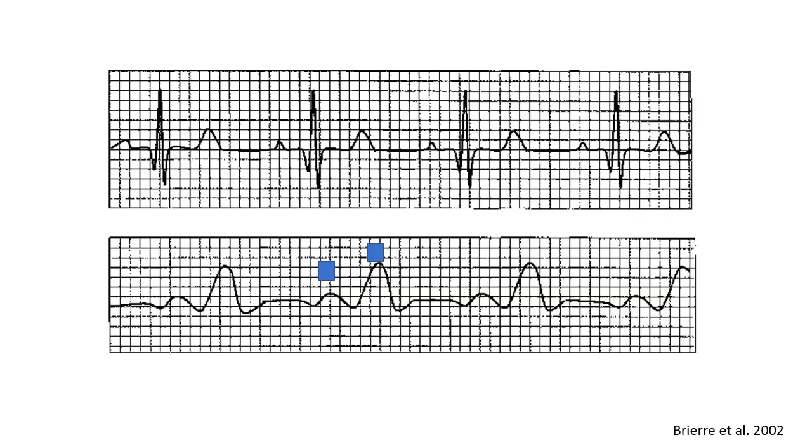All right, so some examples of waveforms. Let's think back. We talked about the two main positive waves being the A and the V wave. If we remember that the A wave corresponds to atrial contraction, then the A wave should happen after the P wave, right? Sorry, I should say that this is our pulmonary capillary wedge pressure tracing we're looking at. If the P wave happens and then the next positive wave is our A wave, and if we draw down from the QRS, it's going to hit the A wave, then hey, this must be the A wave.